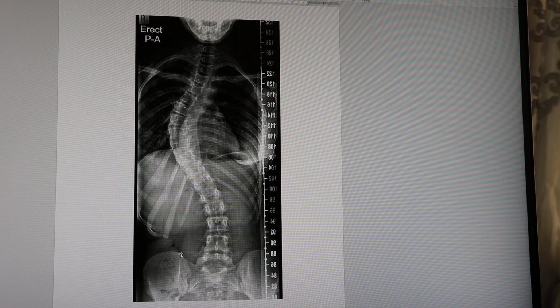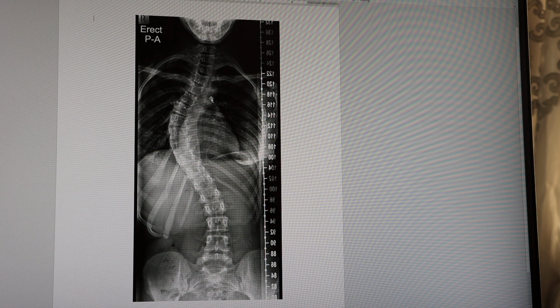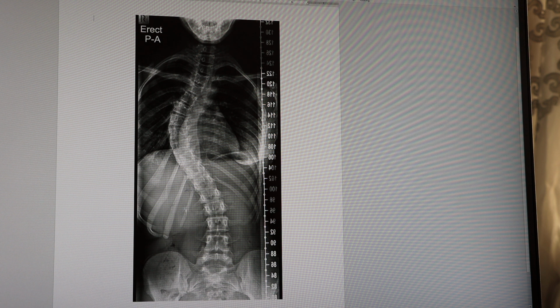angulation of the pelvis. Now, just to make sure that the right marker is in a proper place. This is the heart, so this is the left side, this is the right side, so this marker has been put correctly. Now the first step is to have a general look at the spine. As you see, the image should include the thoracic cage as well. Now here it's cut short.